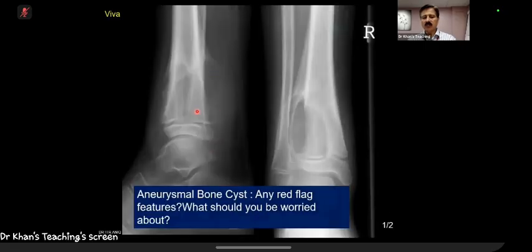It will be a cystic lesion, and you can confuse it with an aneurysmal bone cyst. I've seen in my career 2 medical legal cases like this where we mixed it up, and in just 2 weeks down the road, it just blew up.